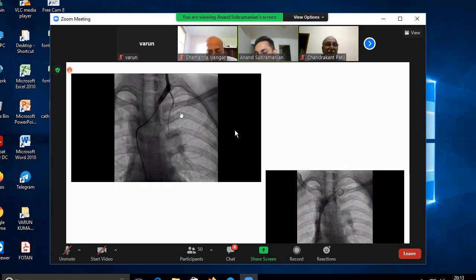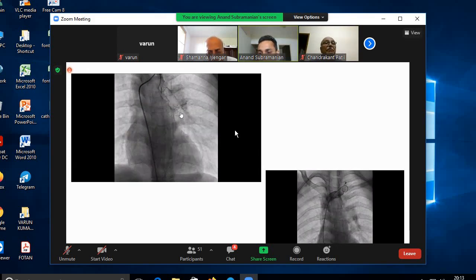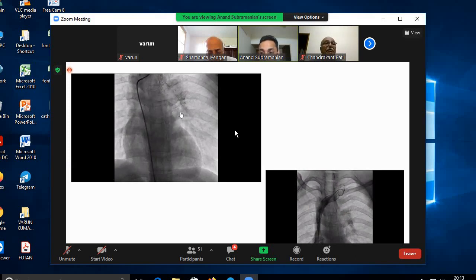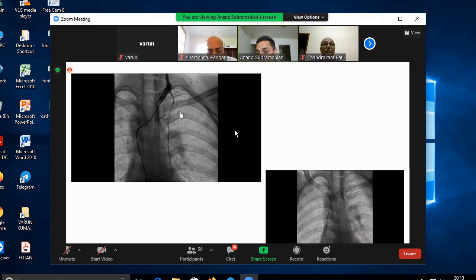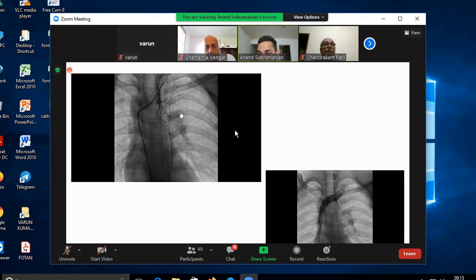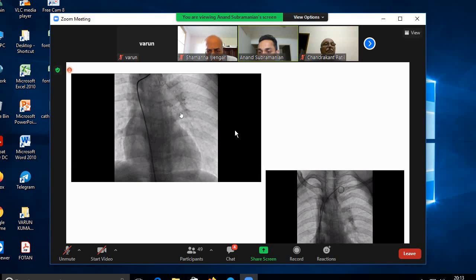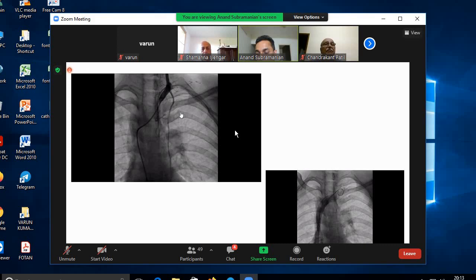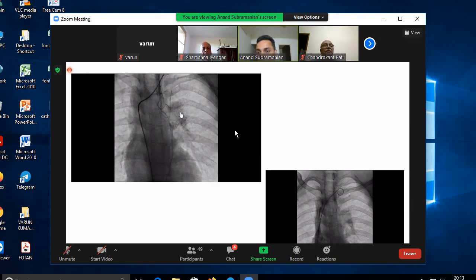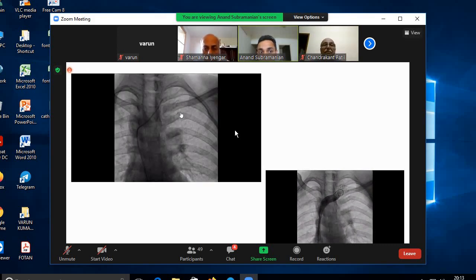One is that the left-sided vena cava normally should drain into the coronary sinus, but there are associations where, in a patient with TOF, the coronary sinus may be unroofed, in which case it drains directly into the left atrium. The surgeon is not going to go dissecting into the neck to see where the left superior vena cava is, so this information should be given to him pre-op. If you have missed an unroofed left superior vena cava, the patient is operated on, and despite a successful TOF correction, the patient is going to remain blue or cyanosed. We've had this happen in one or two instances, especially in small infants, where the LSVC was not picked up preoperatively.